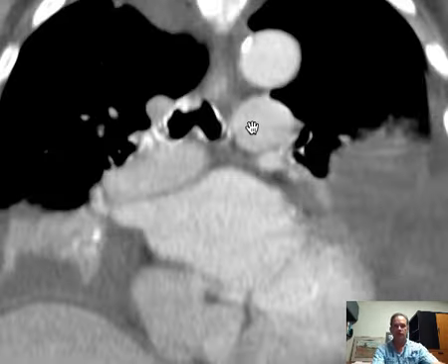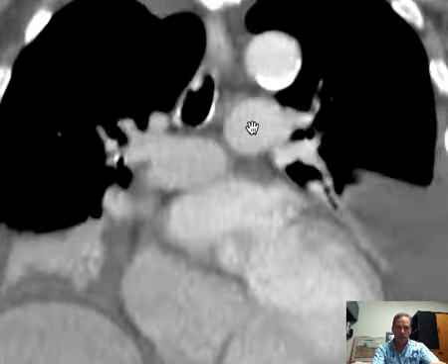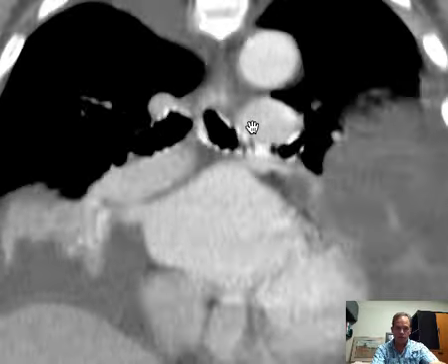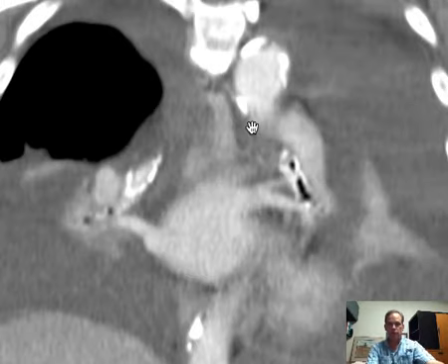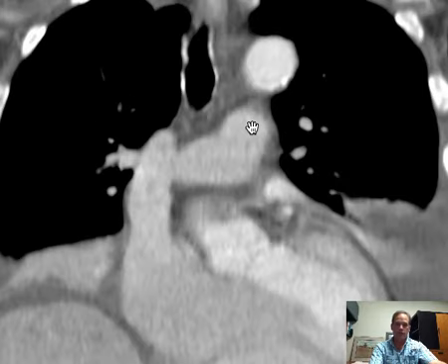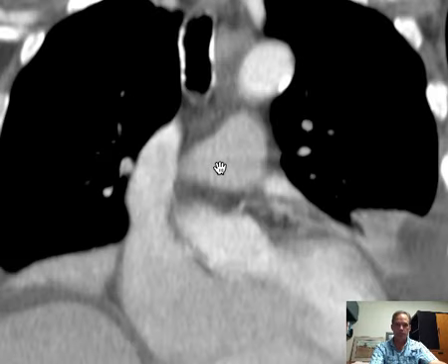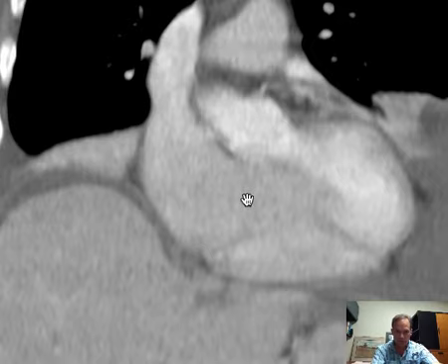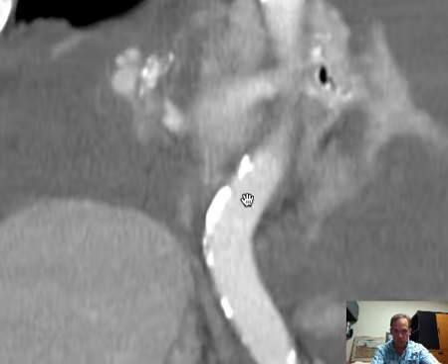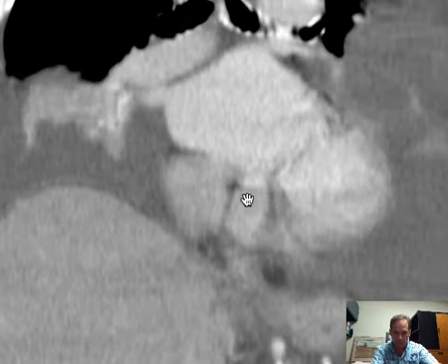And lastly, for the vasculature, let's see what we remember of the venous structures that supply venous return to the heart. First, you have the inferior vena cava. Let's see if we see that very well here. You always see it to one extent or another. Here's the aorta coming down.